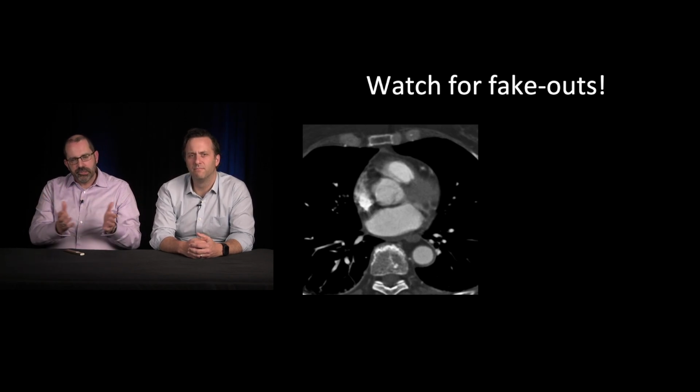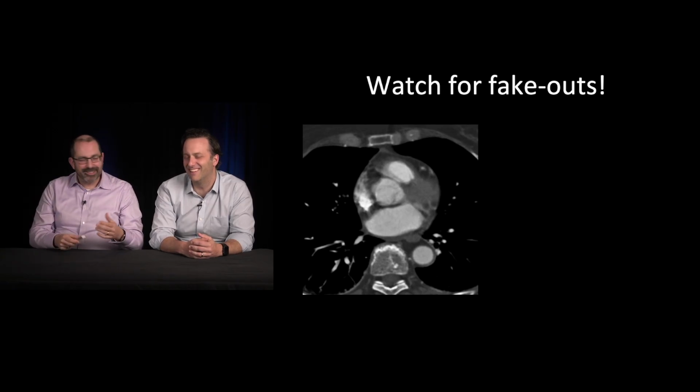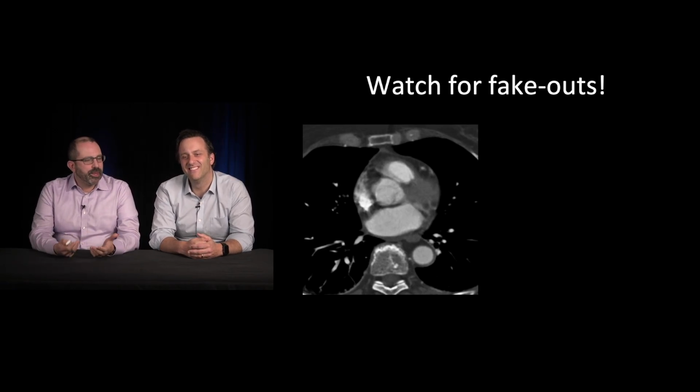Unlike with a PE study, where you can tell someone to take a deep breath and you get a static image of their lungs, you can't tell people to hold their heart. That doesn't work so well. And so that's a common fake out.